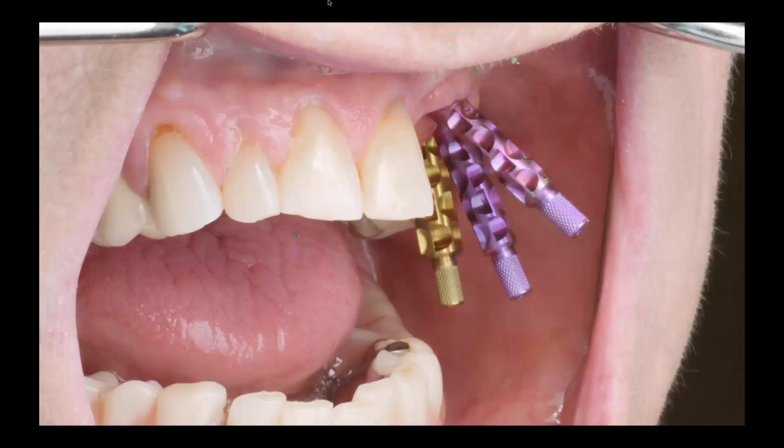This is a case that was restored at MUSC with really severely poorly placed implants. Here are the impression copings. You don't have to have a lot of dental or implant experience to understand that especially the most anterior implant is severely malpositioned, and it's questionable whether or not it's even restorable.